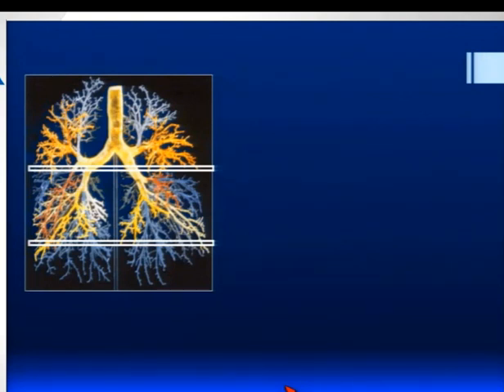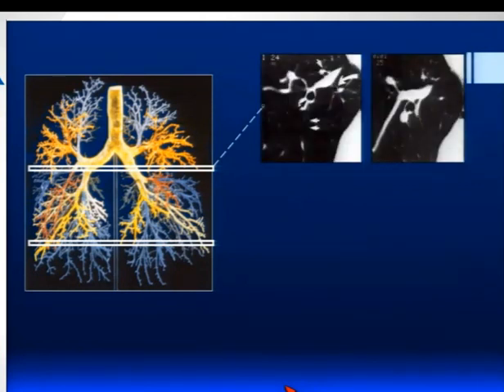So when do we get it wrong? Well, if you look at airways which are too central, you have a chance of getting it wrong because we know from various studies that the airway and the accompanying pulmonary artery, which is the yardstick that we use to determine whether or not there is bronchial dilatation, they don't always branch at the same time. And also, because of the obliquity of the section, you will get a spurious effect of bronchial dilatation if you're looking at very central airways.